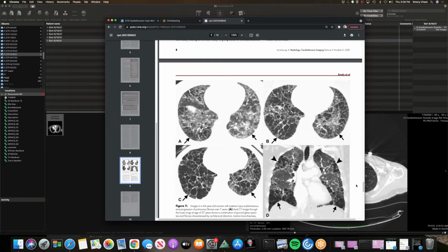Most of the patients with lupus who develop some form of severe fibrosis, NSIP, it can happen, but a lot of them have, under really detailed workup, mixed connective tissue disease. It's not just lupus. But I've seen this pattern many times in lupus, and again there's not a ton of volume loss. The airways usually aren't even pulled open. There's very little bronchiectasis. I'm actually curious pathologically what's there. We label everything that's cystic that looks weird fibrosis, but I wonder how much of it is actually fibrotic. I'm sure there's some there.